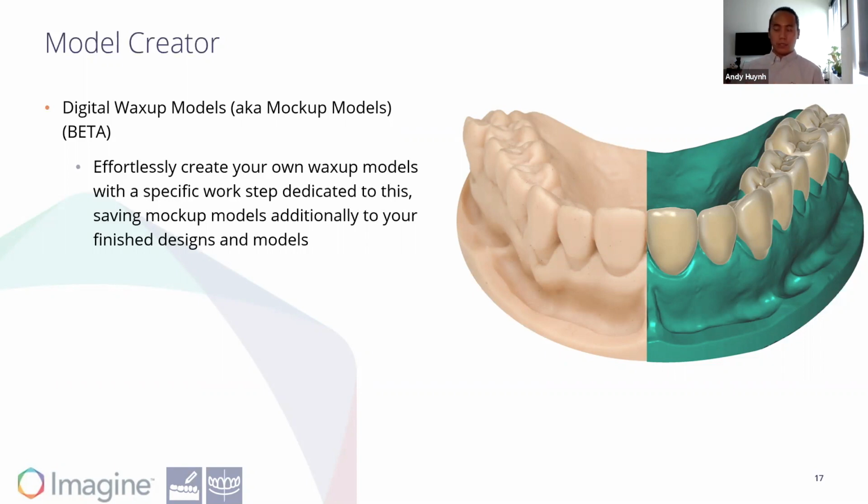Before, we'd have to go into the expert mode, select the whole exterior, and delete the inside. It was very cumbersome, but now they've made it much more streamlined for creating quick diagnostic wax-ups for dentists to show patients, because the easiest way to sell a case is to show them the final result very quickly, and this is the best way to do that.